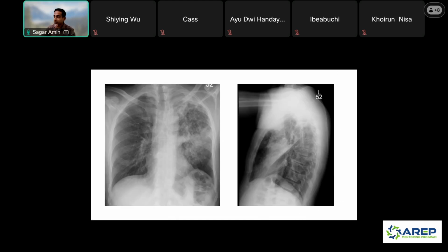So we have another radiograph. Is the abnormality on the left or the right? So it's on the left, right? So compare the right and the left. There's opacities in the left upper lobe and mid left lung. If you look really closely, you can probably see these little dots here. So all of these are also abnormal opacities. And if you look very closely, you might be able to see that there's a cavitation here in the left upper lobe.